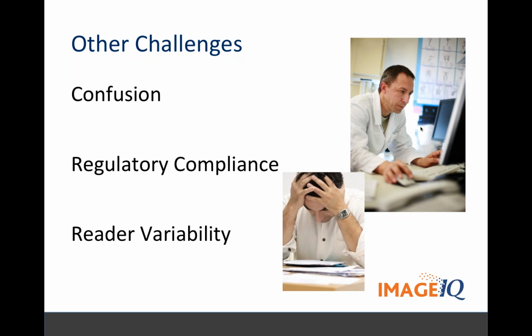So, let's say a different time point comes along, you have something 6 months later, and you're making the same measurements for these target lesions. You have no way to figure out which ones you made the measurements for, and if you had to go back and make a change to one of them, it's really hard to bring that back up and make those changes. Yeah, absolutely.